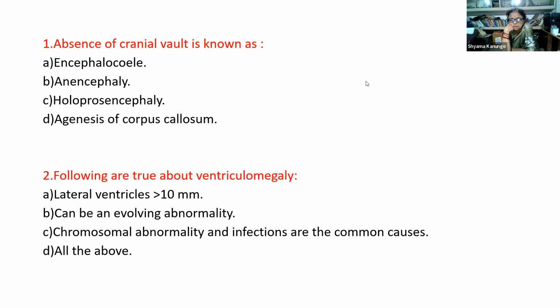Ashok sir, you will also comment on this whenever you can add something. Different varieties of anencephaly. Professor Khurana, please. Yes, this is exactly as Dr. Hashmukh has told us. Some of them are completely anencephalic from the beginning, but it could also be that initially there was just the acrania, which then progressed to wearing off of the brain, which we now call exencephaly, and finally goes on to anencephaly.